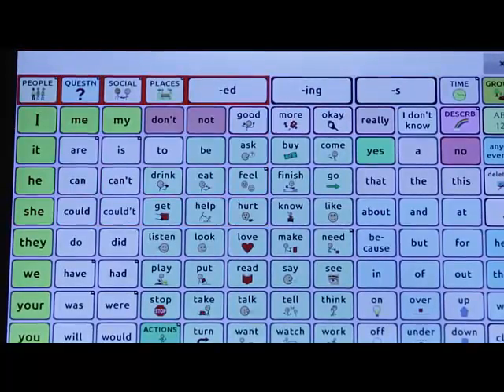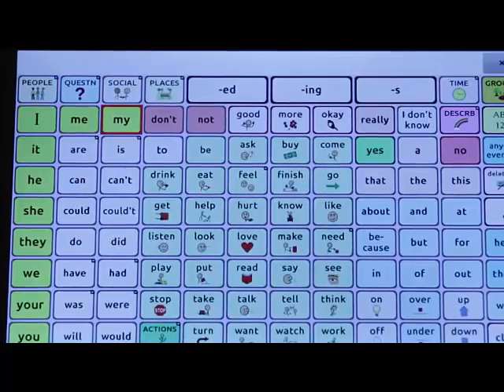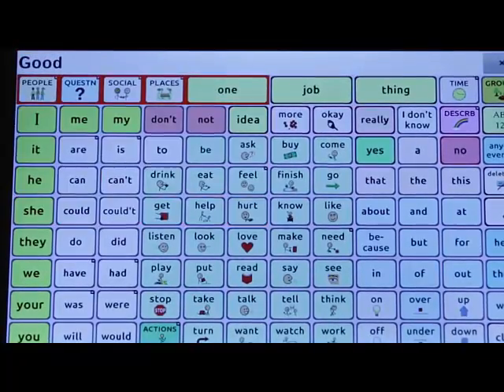When I am in the block setting, I can decide I want the pattern to continue in blocks or switch to row column within the block. This demo will use a single switch and a block pattern with row column within the blocks.